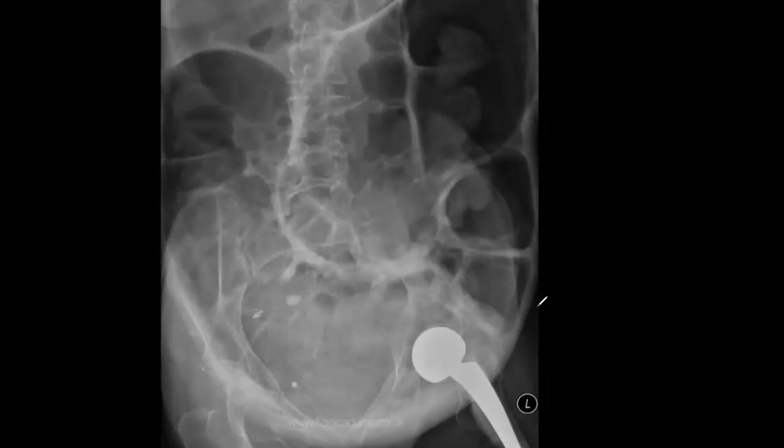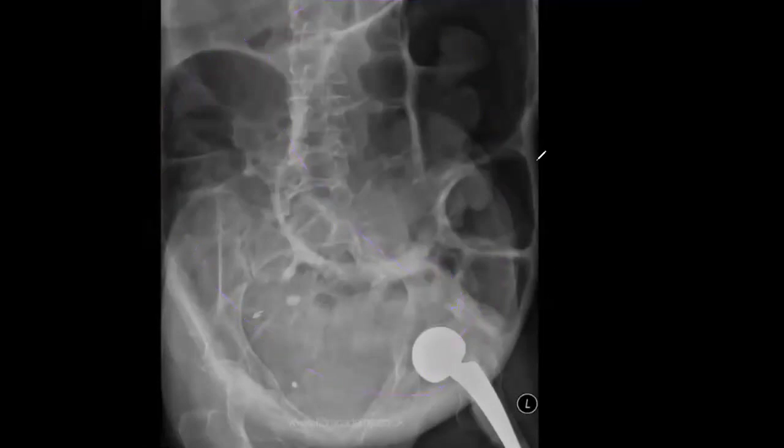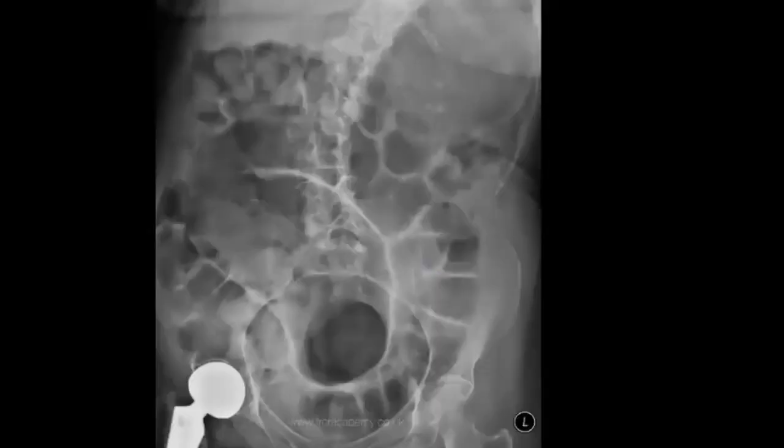Yes, so this one is, yes, colonic obstruction. Which type? I will try to like this as twisting, starting from the, yes, so there is sigmoid volvulus. Sigmoid volvulus starting from the left iliac fossa.